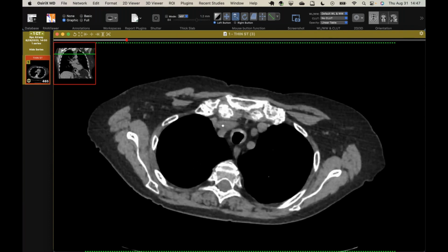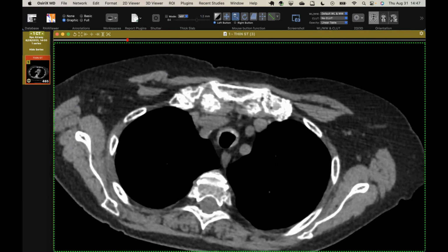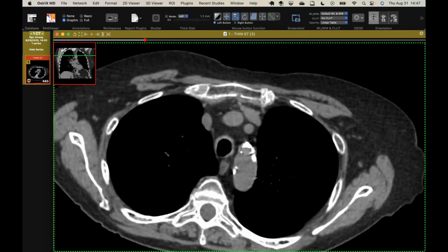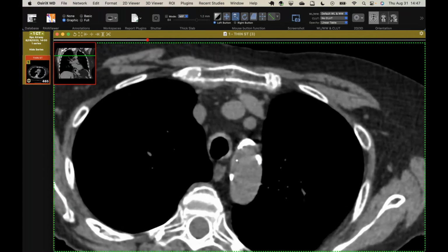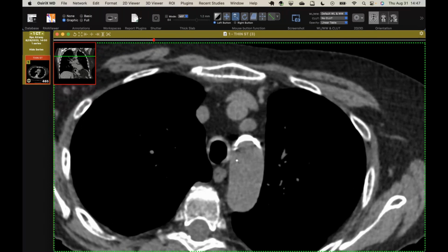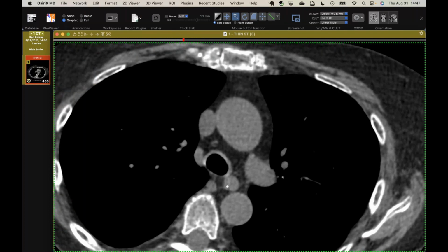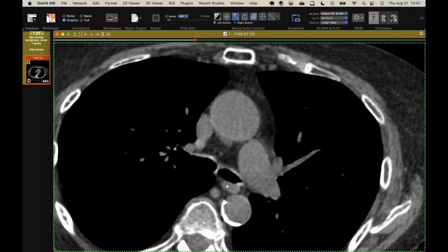And what's interesting is, it's not the most severe case, but if you look at the airway, it's already abnormal. The posterior membrane is nice and thin, but the cartilaginous portion of this trachea is too thick already. This is not a normal looking trachea, and there are some calcifications scattered throughout, but it consistently spares that posterior membrane. And then if we go out to the carina, it gets so thin back here.